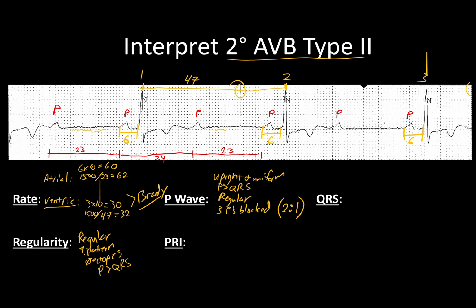So that would say 6 times 0.04, 0.24 seconds. That is long, but it's consistent, in that every single time it's the same length.